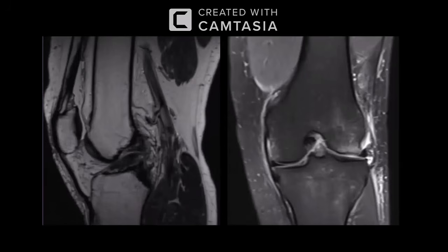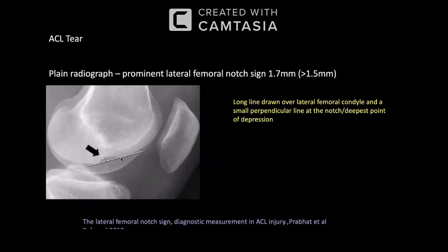Like you said, probably we need to scroll and see, but definitely somewhere near the mid substance there is some partial tear on the proximal aspect, from the femoral aspect. What I want to show is this aspect.